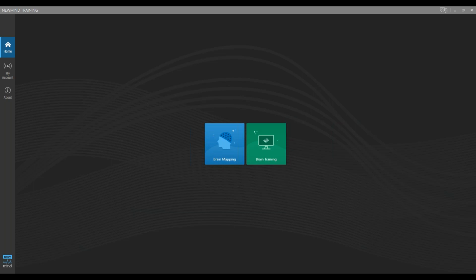Now, if you were using some kind of outdated software, something like BioExplorer, that does not have the ability to block out that artifact, I would be less likely to want to continue that session until I really figured out what the problem was.